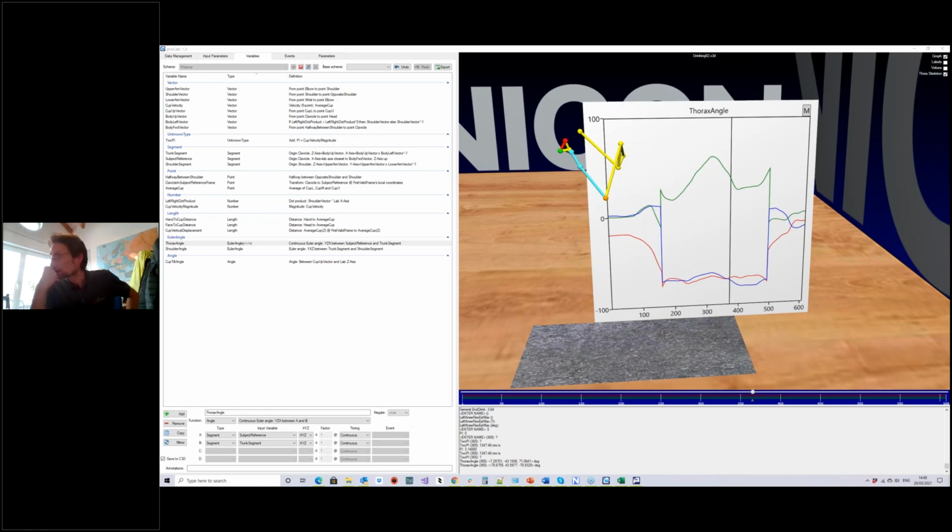Although in bodybuilder, when you specify the segment, maybe you can also use a left-hand token, as well, while you have X, Y, Z, which would be right hand or something.